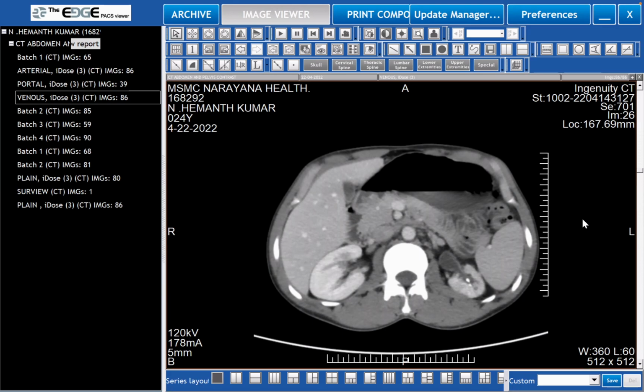So why is that so difficult to come to? So this patient had undergone ESWL 5 years ago, for presumably, let us say, the same stone, what you see presently. What is your comment on that? Sir, please repeat, sir. Suppose I say this is a stone, would you give lithotripsy? This is not tuberculosis, this is a stone. Today, would you give lithotripsy or are there contraindications to lithotripsy?